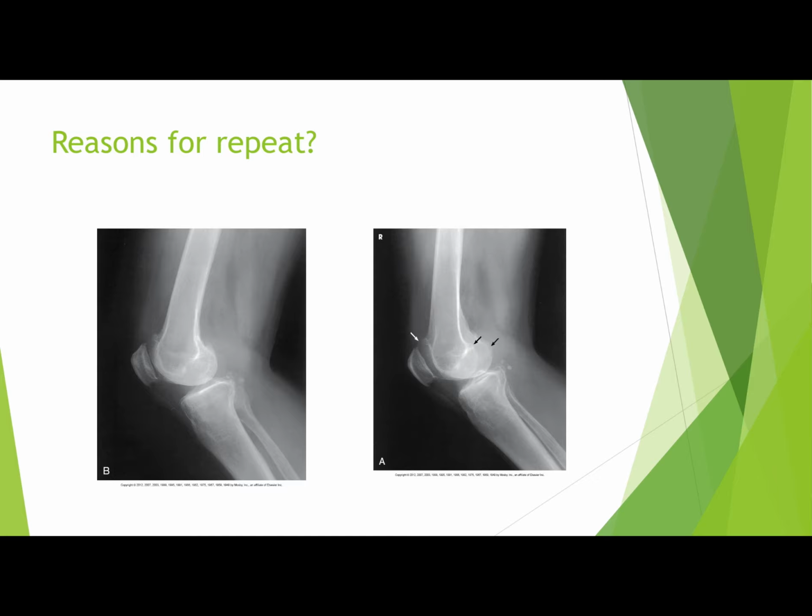The one on the left is correctly positioned, whereas the one on the right could have been positioned better. The radiograph of the lateral knee on the left has the patient properly rotated towards the bucky with a 5 to 7 degree cephalic angle of the central ray, so that the femoral condyles are superimposed anteriorly and posteriorly, as well as inferiorly and superiorly.